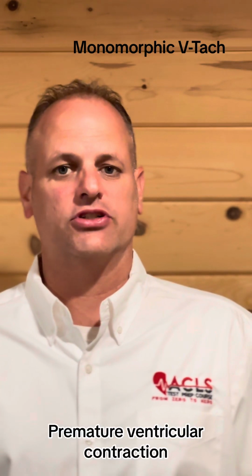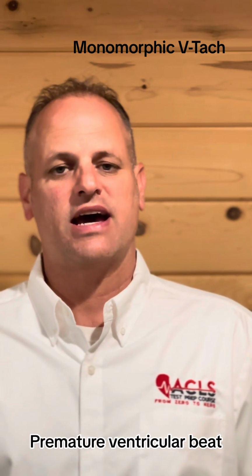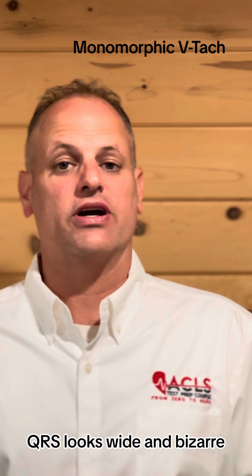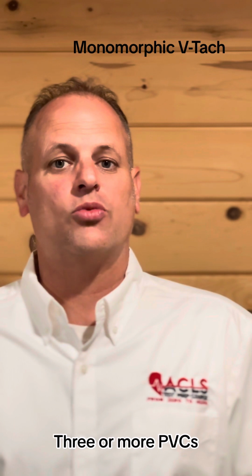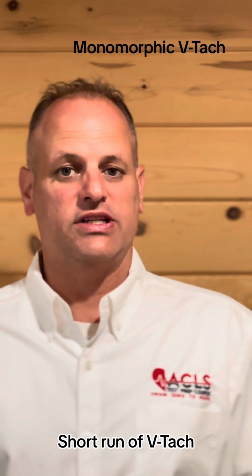Recall what a PVC is, a premature ventricular contraction. This premature ventricular beat happens earlier than expected in the cardiac cycle. There's no P wave, and the QRS is going to look wide and bizarre. This is generally due to irritability. Now, if you have 3 or more of these PVCs, we call this a short run of V-Tach.